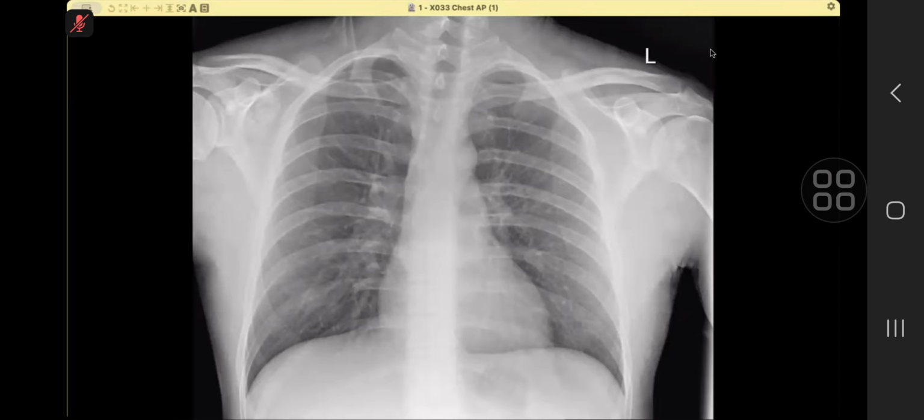The cardiomediastinum, there is slight. I'm looking at the left heart border. It also seems to be unremarkable. Now I'm looking at my review areas. The visualized bones and soft tissues are unremarkable.